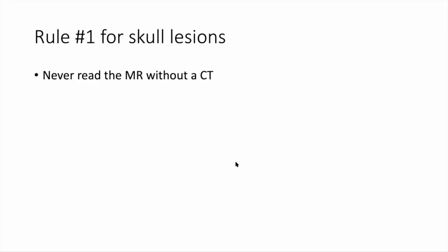So remember, for those of you who missed it at the beginning, the number one rule I have for skull lesions: don't read the MR. I mean, you can read it, but you want to say in the end you'll offer a firm differential when you see the CT, because some lesions, particularly fibrous dysplasia, can look quite malignant on the MR scan, but prove to be a benign lesion.